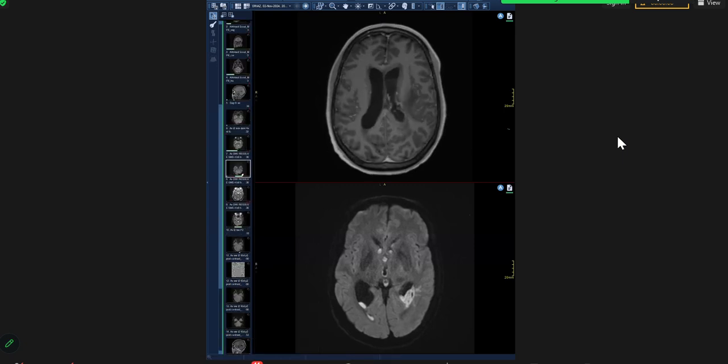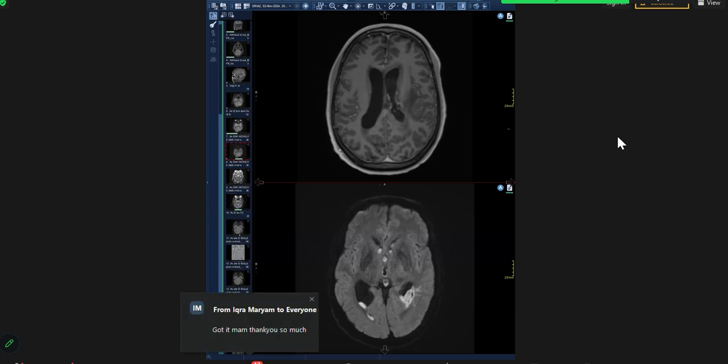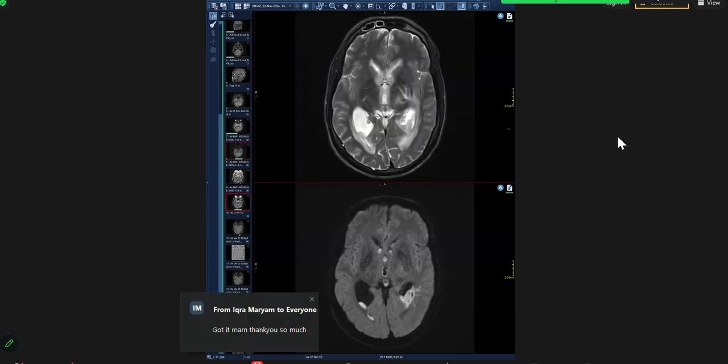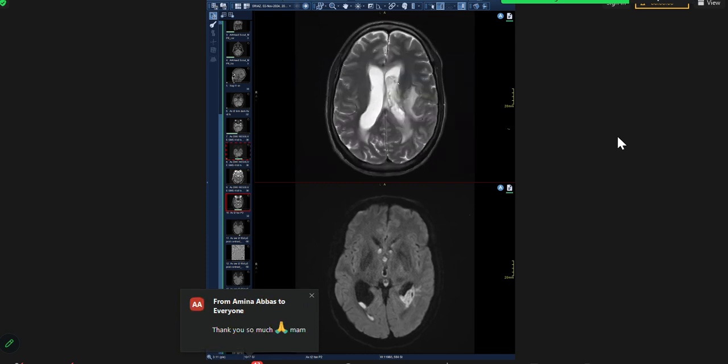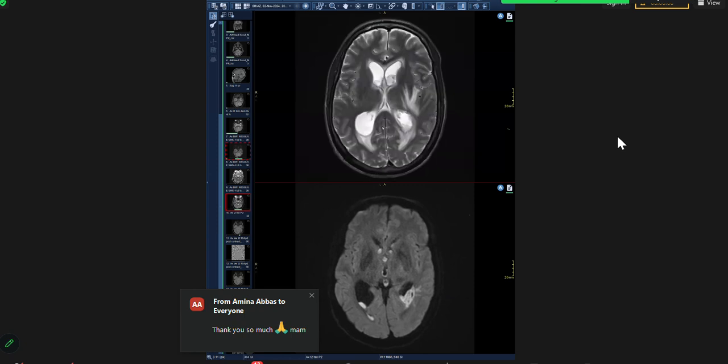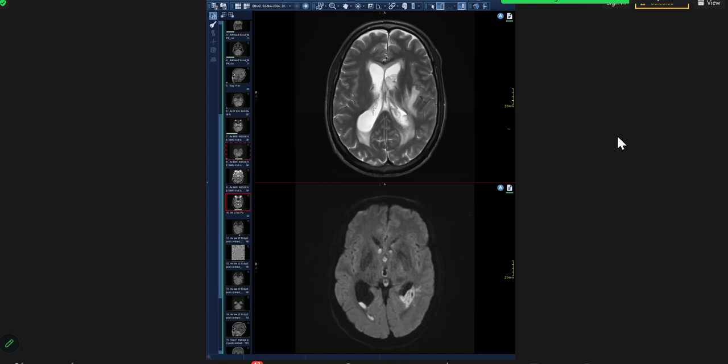Let me bring out a T2 weighted, where's the T2 image? So the ependymal lining is the lining, and ventriculitis or ependymitis is going to be more or less the same thing. I also got a bit confused. Ventriculitis and ependymitis. Just quickly see that.